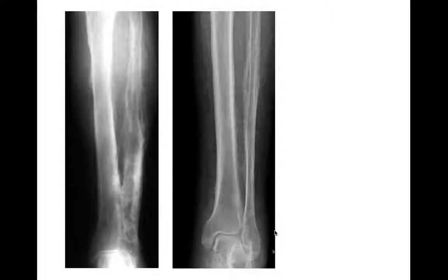Not the most common appearance of a periosteal reaction in venous stasis, but long-standing venous stasis is a common cause of periosteal reaction. You see that in the lower extremities a lot. Here's a more typical case of periosteal reaction from venous stasis disease. This is a more solid periosteal reaction along the fibular shaft and to a lesser degree along the tibia, both due to venous stasis.